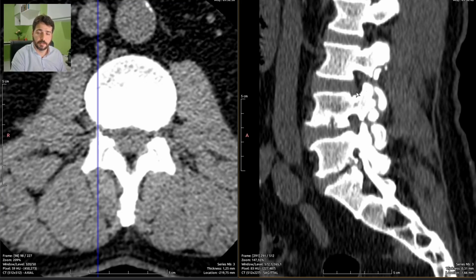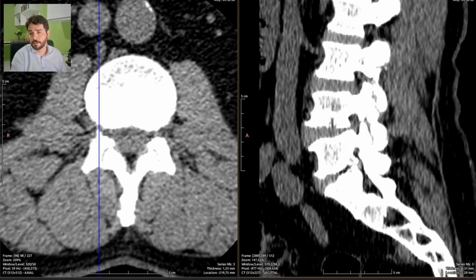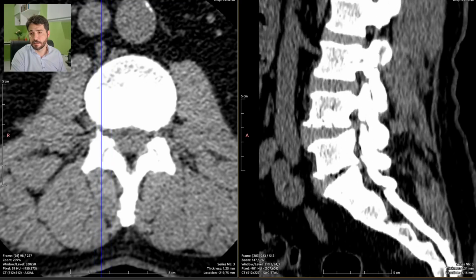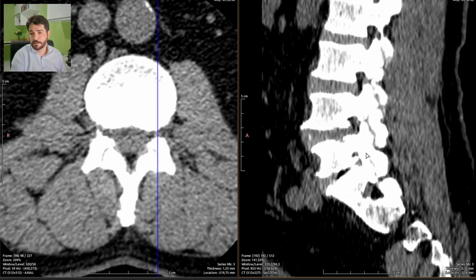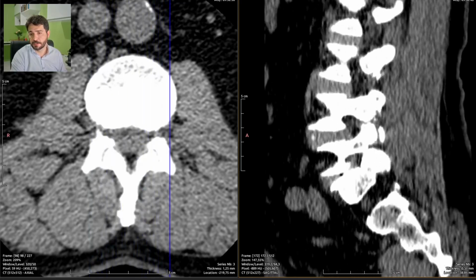On L3, L4, even with the herniation reaching the foramina, we don't have a stenosis per se, but on L4, L5 we have mild stenosis because there is disc and other structures touching two sides of the nerve roots, and in this case we have a compression and deformity of the nerve roots by bone, ligament, disc, herniated discs, and all this good stuff right here.